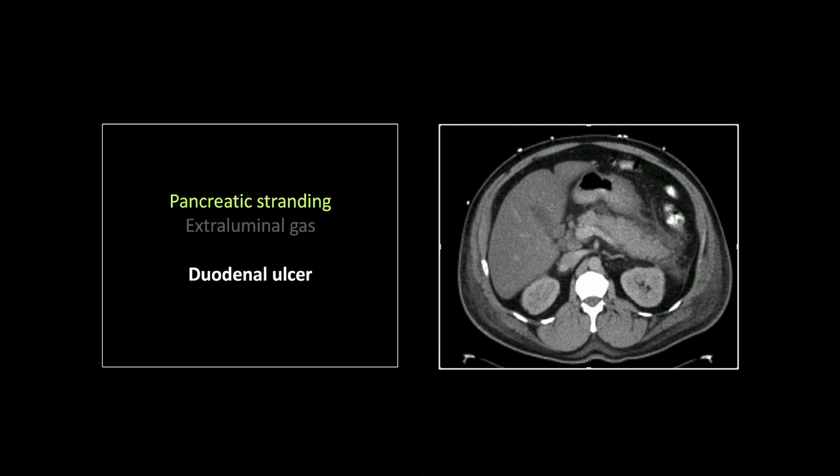All right, this is what I looked for a long time. A duodenal ulcer causing pancreatitis. And yes, I did say duodenal. Every once in a while I'll screw up and say duodenal.